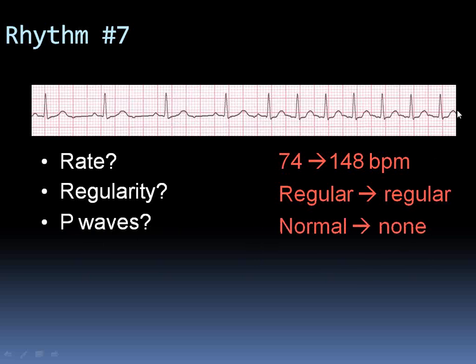And we can see no P waves, as we had just discussed. See? Over here, we don't see any clear P wave. This is a T wave. This is not a P wave. Okay? This is a T wave. Right?